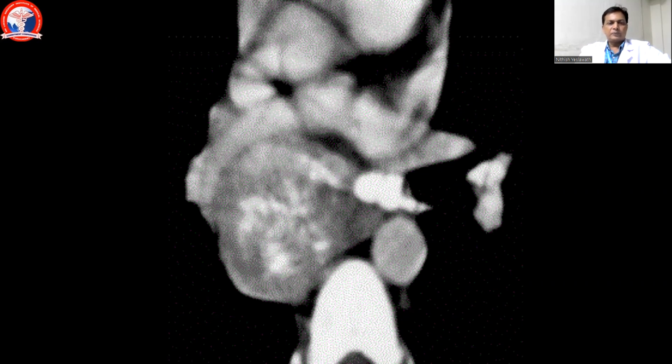So these are calcified mediastinal nodes. These kinds of conditions are mostly sequelae of Histoplasma capsulatum infection, or metastatic lymph nodes can be because of mucinous adenocarcinoma. These are the two main important differential diagnoses for these kinds of features.